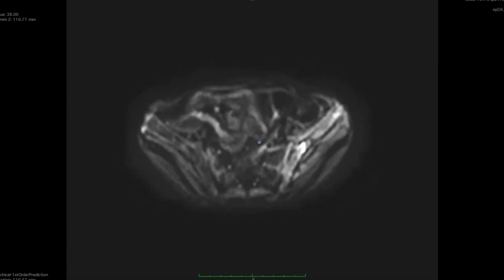So now what am I thinking in terms of? An active on chronic kind of process. My differential list is the same. The differentials would include features of myelofibrosis versus conditions in which there is abnormal hematopoiesis. A third differential diagnosis would include infiltrative processes like blood dyscrasias such as leukemia, ALL, etc.